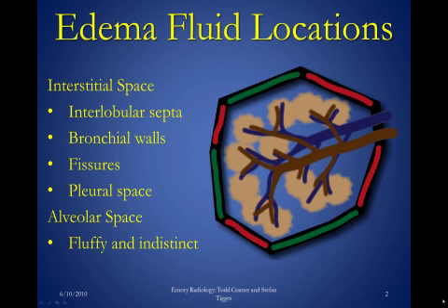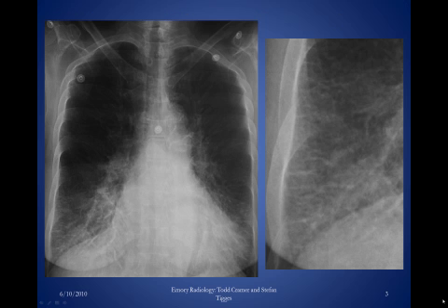Here's the chest X-ray of a person with interstitial pulmonary edema causing Kerley B lines. Kerley Bs, which are sometimes called septal lines, are found at the lung bases at or near the costophrenic angles. Normally, the peripheral interlobular septa, which make up Kerley B lines, are too small to be seen on a chest film. However, when engorged with extra fluid, they become visible as these short parallel lines that reach all the way to the periphery of the lung.